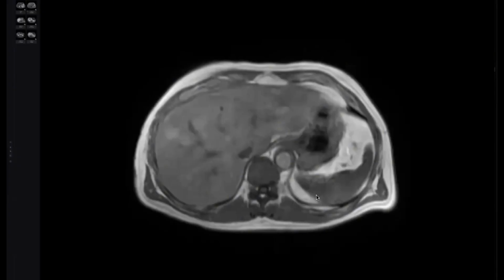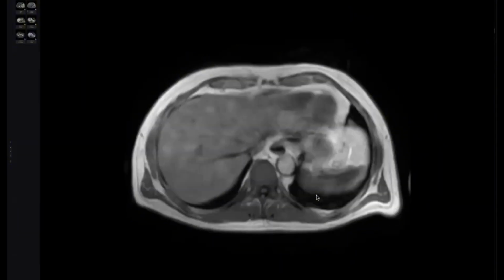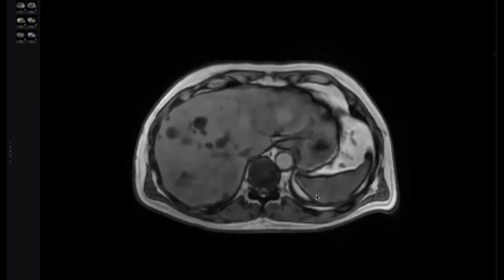Not has a fat component. All of this is fat component. It's a fatty lesion. So this is not metastasis. This rules out metastasis, and these are fatty lesions. Give me a differential diagnosis for fatty lesions. Adenomas.